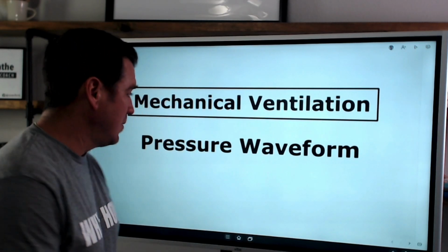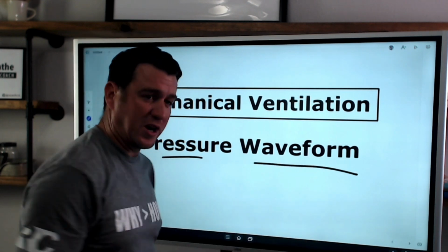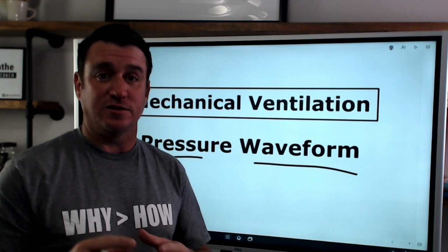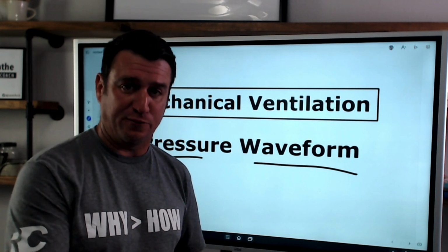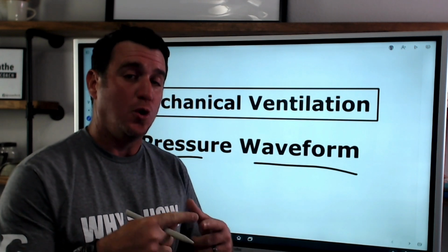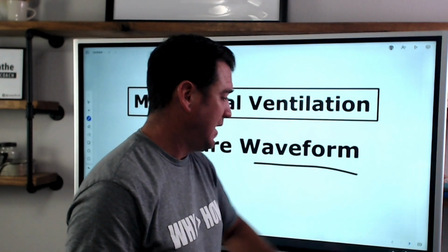Welcome to this video all about the pressure waveform. We're going to break this down and make it make sense for you so that when you are taking your TMC exam or just standing in front of a ventilator, you feel more confident in what you are looking at when observing waveforms. Let's look at it.